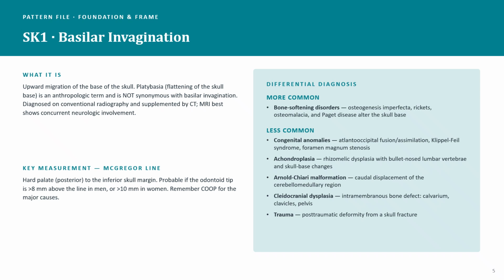Again, this is your basilar invagination. Another thing that you might see in this type of patient is they might have a defect in the calvarium. Sometimes there might be defects seen in their clavicles and their pelvis, or it can happen as a result of trauma, and also it can happen as a result of a skull fracture.